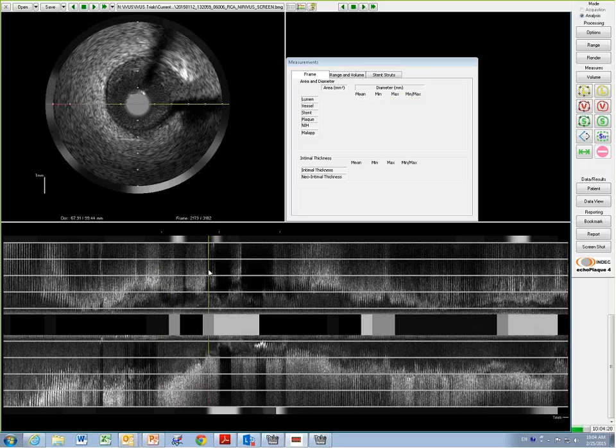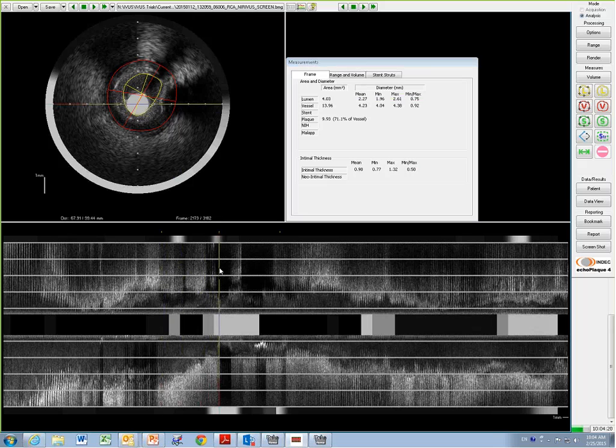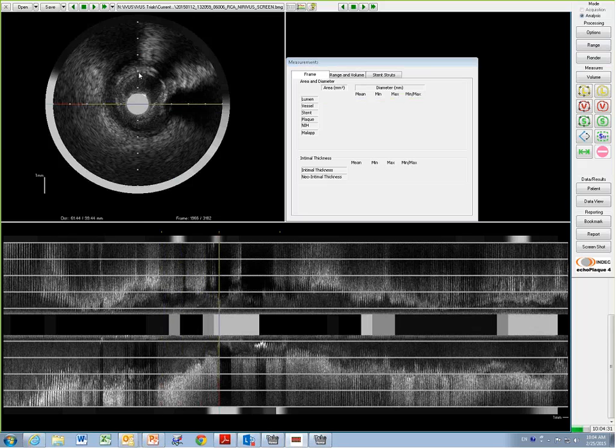And then I can see in the middle, this is quite interesting because angiographically not too much, but I can see the lumen is here and EEM is here. So I do believe you agree this is a lot of plaque burden. Yeah, it's lots of plaque burden, but as I said before, the reference diameter is so big.